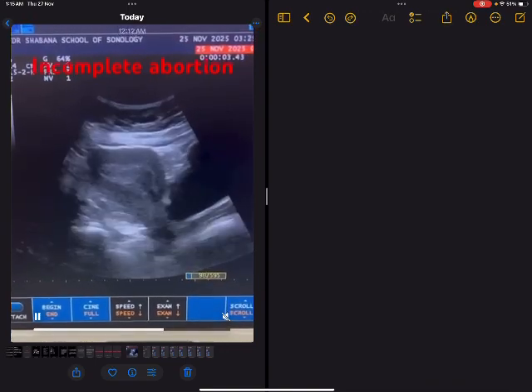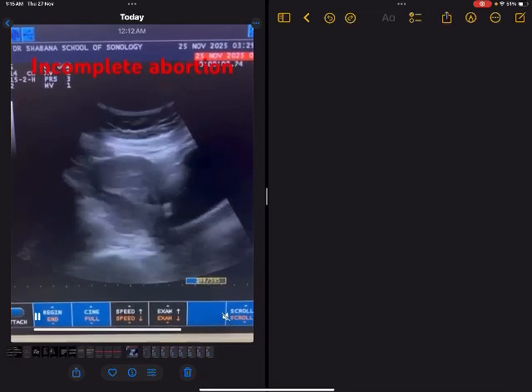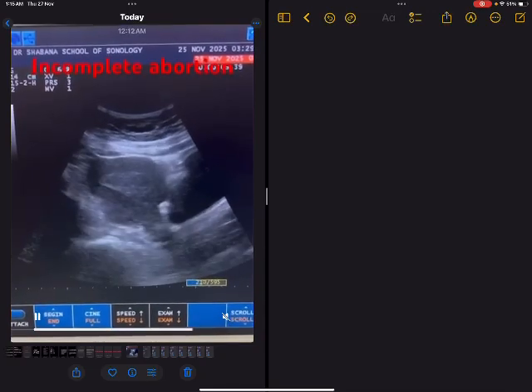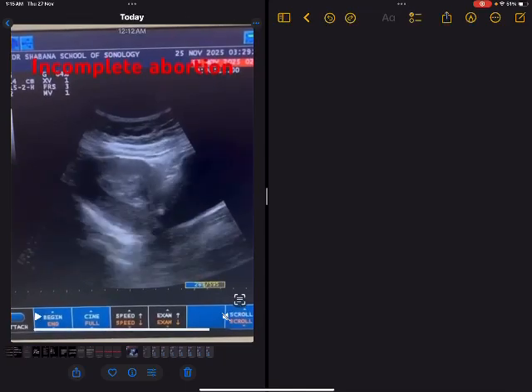So here I want to discuss with you what could be the other possibilities and what are the other things that can mimic RPOCs. In case of RPOCs, you can see irregular echogenic foci, and there will be mild to moderate vascularity.